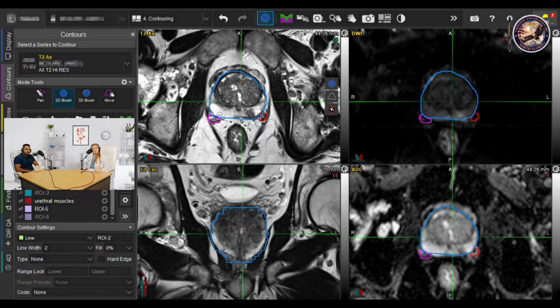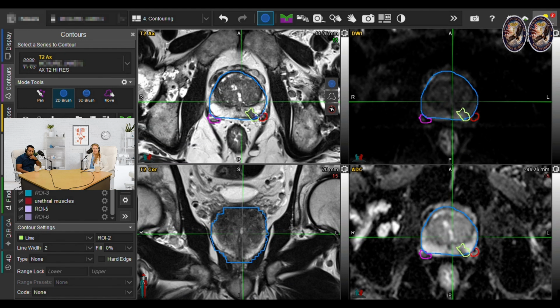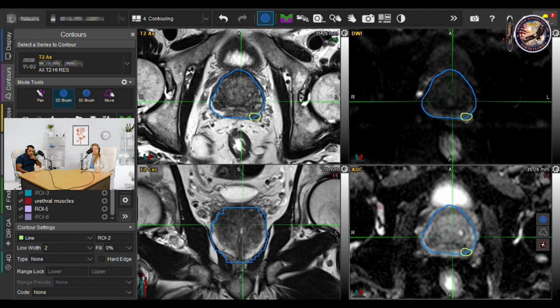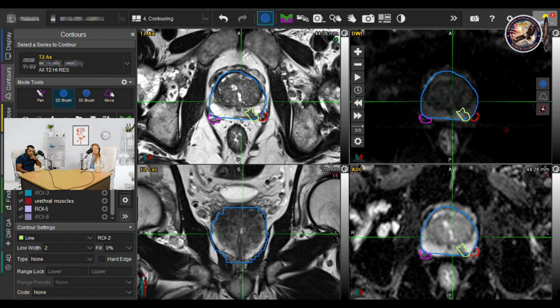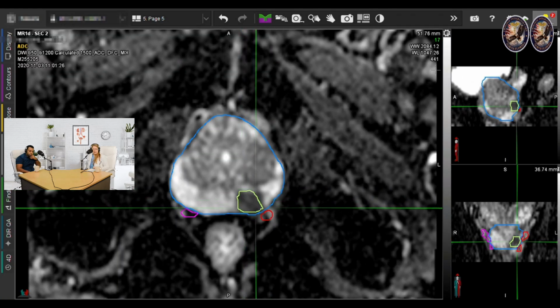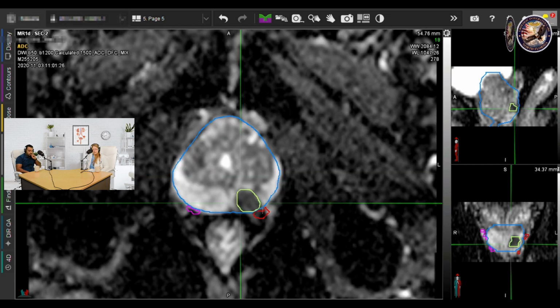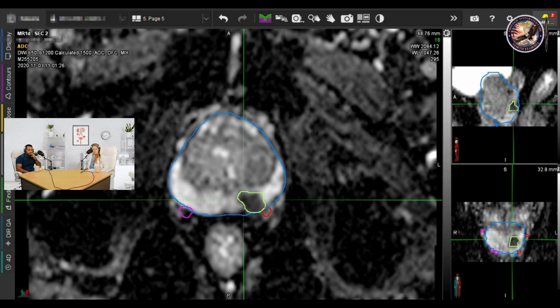Now, we're going to go through a video here of a high-risk cancer. As you can see, this is something that we're outlining here. You see the prostate, peripheral zone. The tumor is coming out, actually, of the prostate. And this tumor corresponded to a Gleason 4+4 tumor. The ADC values here were 278 micrometer square per second.